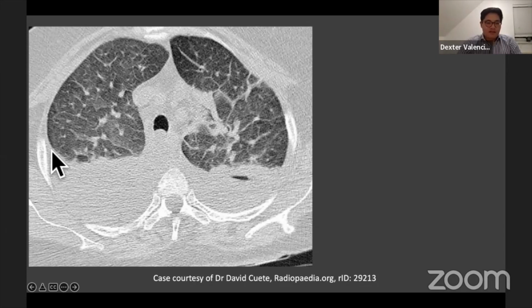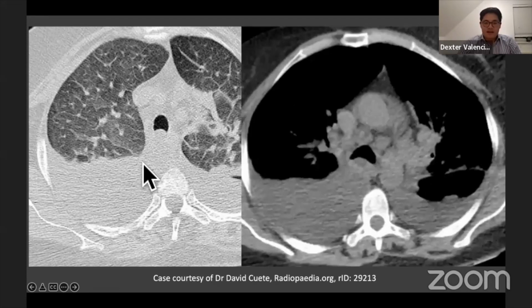We can see these big menisci here. So we've got lung and soft tissue windows. These are pleural effusions, well, these are sort of small to moderate size pleural effusions on the right. On the left, this is probably a small one. If some of you have noticed, the lungs look a bit ground glassy. You can start to see a few polygons, hexagons, lobules. So this is a patient who has cardiac failure and bilateral pleural effusions.